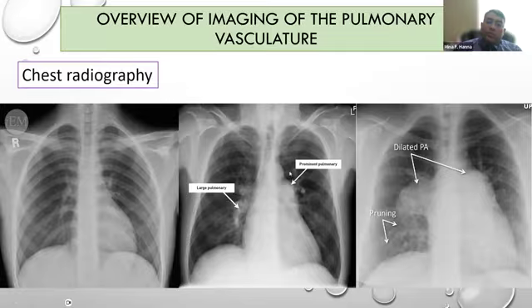In patients with pulmonary arterial hypertension or a dilated main pulmonary artery, you see peripherally in the lung very scanty vessels. The vessels are not as much seen as here. These decreased vessels, or vascularity, are due to small arteriolar thickening and constriction, restricting the blood flow. That's why there is central dilatation and more distal scanty circulation.